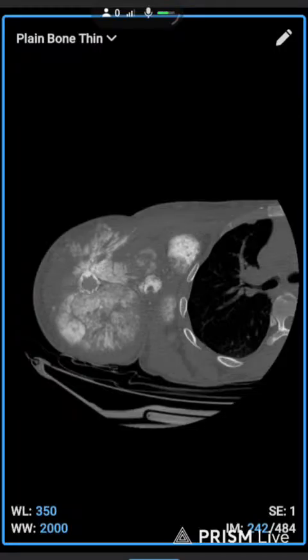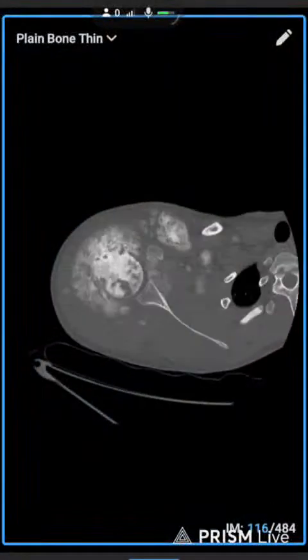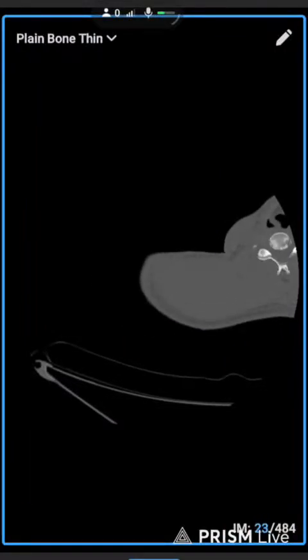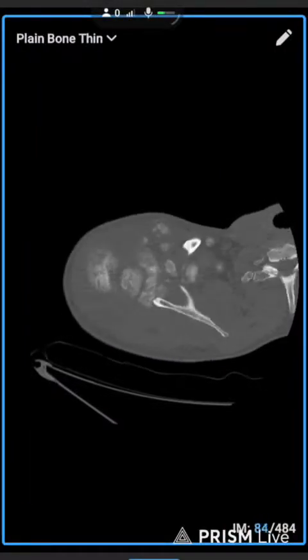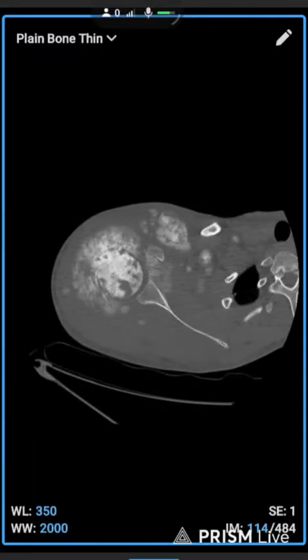We don't find this normally. If you plan a patient, the patient history is needed, so we found the X-ray a bit brighter in this area.